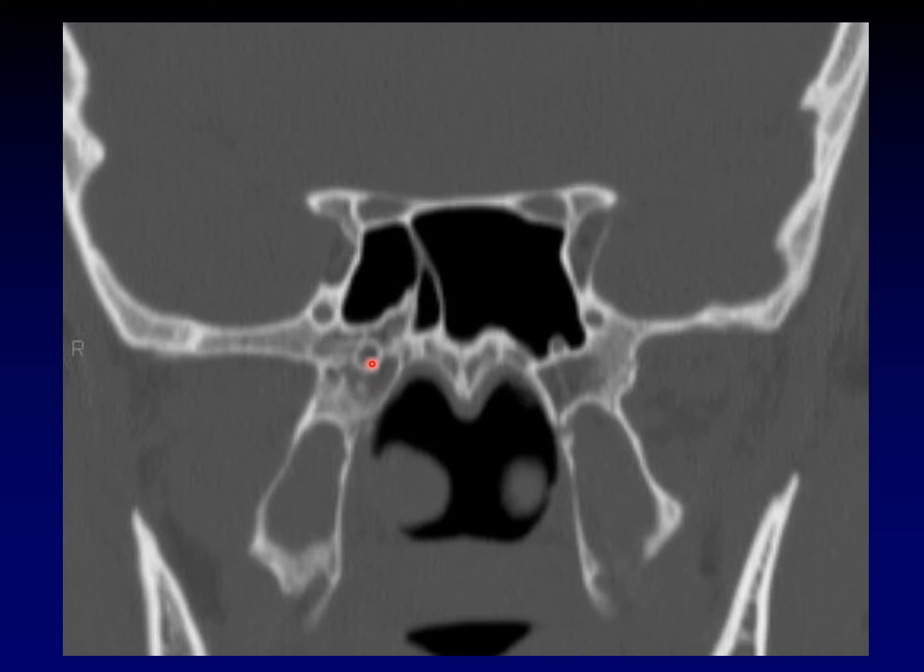Vidian's nerve is going to dead end into the pterygopalatine ganglion a few cuts forward from this, and foramen rotundum here carrying V2. V2 is going to skim over the top of that ganglion. Notice that the sphenoid sinus will sometimes extend out as a lateral recess between those two objects. That's all normal variance. Okay, but the important thing here, foramen rotundum, Vidian's canal.